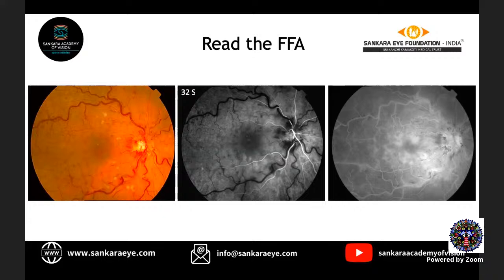Okay, sir. So is there any therapeutic point of view in this case? Because this does not show, as Pradeep had shown, any neovascularization, at least in this frame. Although the superior parts, above the arcade, show some non-perfusion, there's no obvious neovascularization. That means the patient is not an immediate candidate for aggressive PRP.